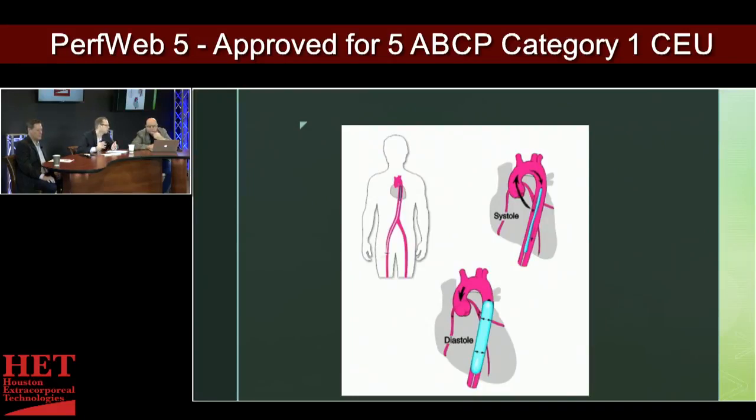So if you have a balloon pump that's placed inappropriately and it's too low and you're trending lab results for whatever reason and you see that their LFTs are going up or that their creatinine is worsening even though they have all other indicators of good perfusion, you can look at your balloon as one of the sources of the problems. And these things are not benign. These are inflating and deflating in an aorta that may or may not have disease. So if you have some atheromatous disease inside the aorta and that balloon is just pounding away at it, you can see how small portions of that could break off and become emboli.